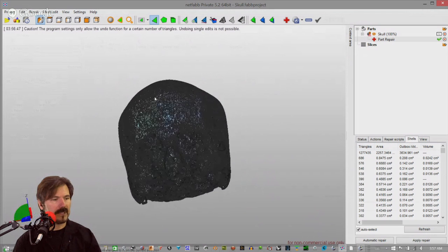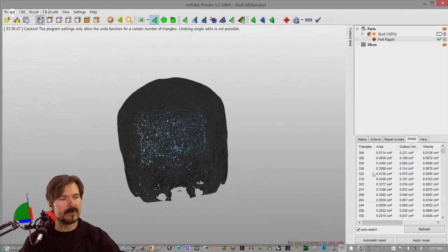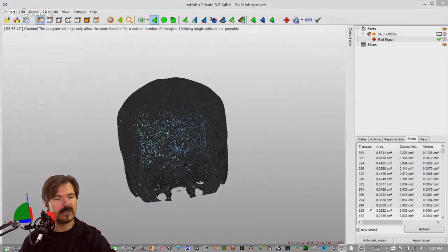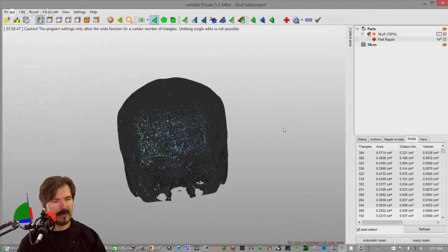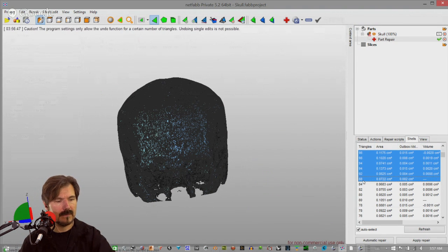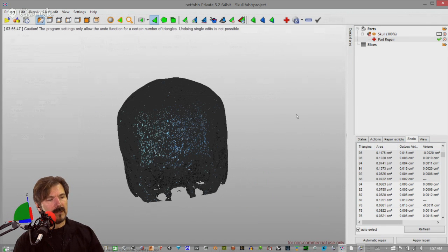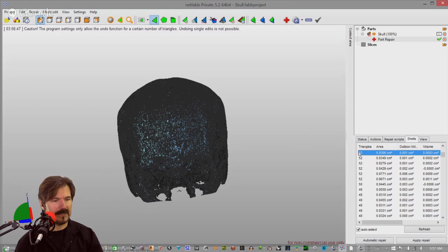One of the reasons that it looks so dense is that, and I don't know if I can turn it off here, but it does look like I'm able to remove a lot of these much quicker now. So I will. Do you remember how many shells were on the other one, Javin? Oof, no, I don't remember. But I think it was in the thousands. So yeah, that probably didn't help either.